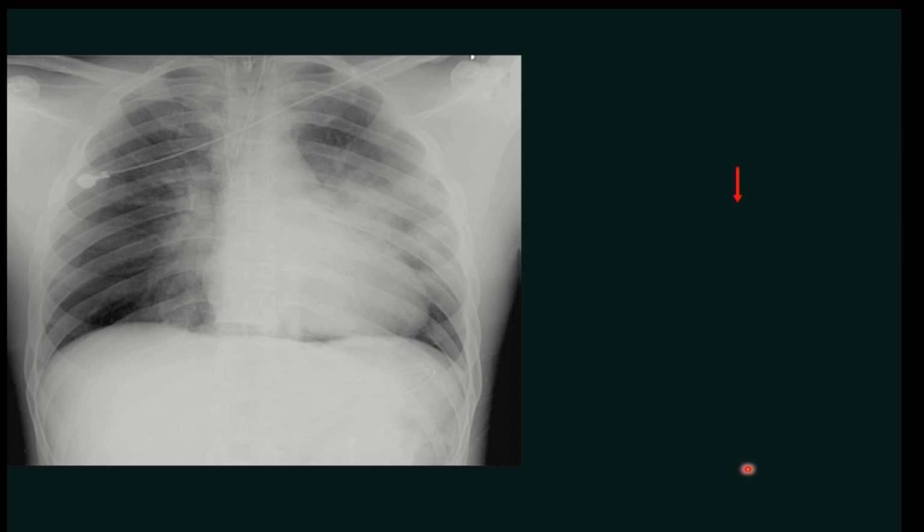I see a lot of residents here. Can you help me with the diagnosis here? What is happening here? Anyways, this is not an exam, so you can at least guess. So can you see something here?